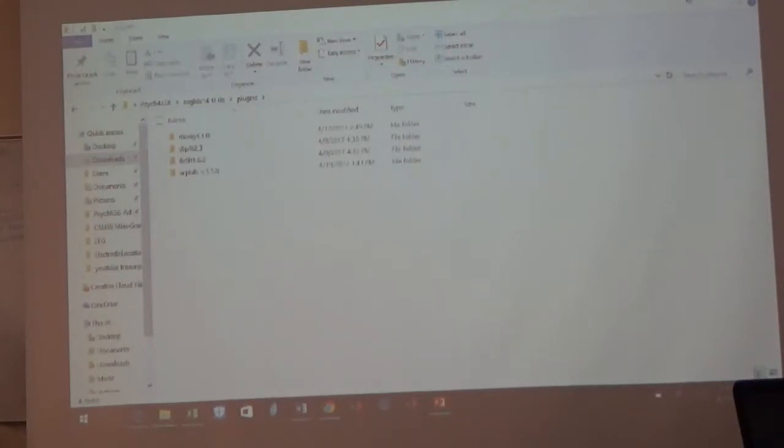So we wanted to do this first. Delete the existing one, because something's funky, it's not working over here, so it's gotta go.